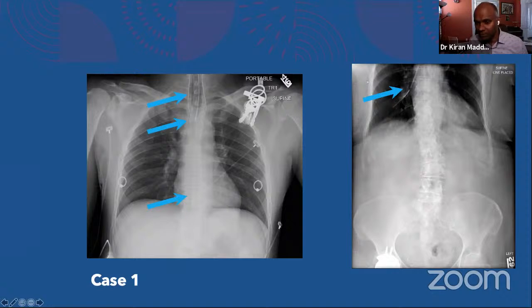And this patient was intubated, and the patient also had an NG tube placed, which went into the right main bronchus. These are the ones which need an immediate call. And this is a regular tubes and lines chest radiograph class, but do not forget that you have to talk about this even in your cases of trauma.